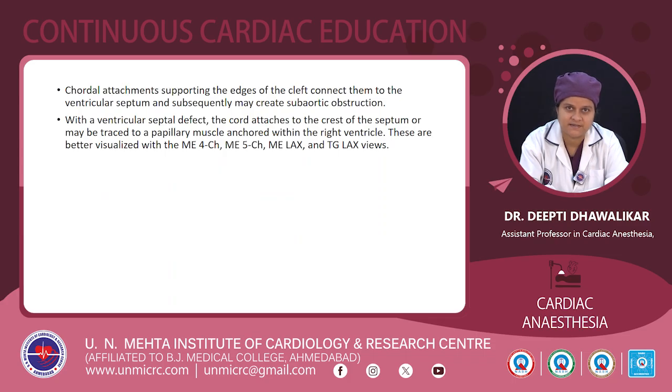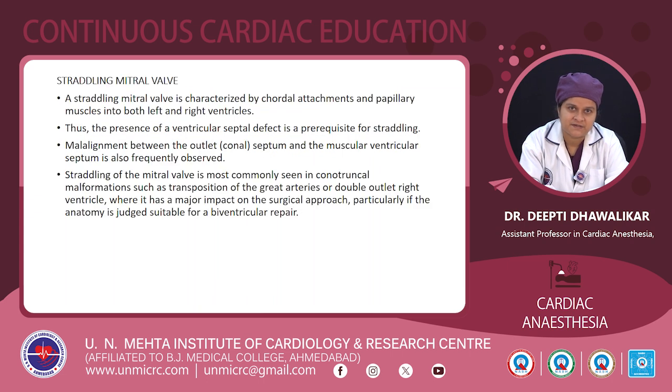Chordal attachments supporting the edges of the cleft connect them to the ventricular septum and subsequently may create subaortic obstruction. With a ventricular septal defect, the cord attaches to the crest of the septum or may be traced to a papillary muscle anchored within the right ventricle, causing straddling. These are better visualized in the mid-esophageal views.